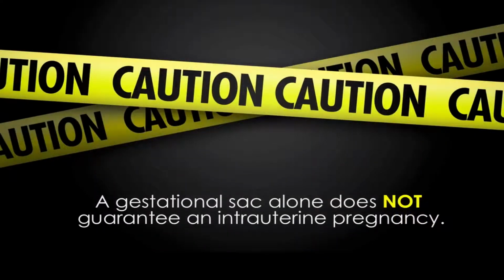It is imperative to understand that a gestational sac alone is not a guarantee of an intrauterine pregnancy. As you will see, there is a similar structure that sometimes appears in ectopic pregnancy.